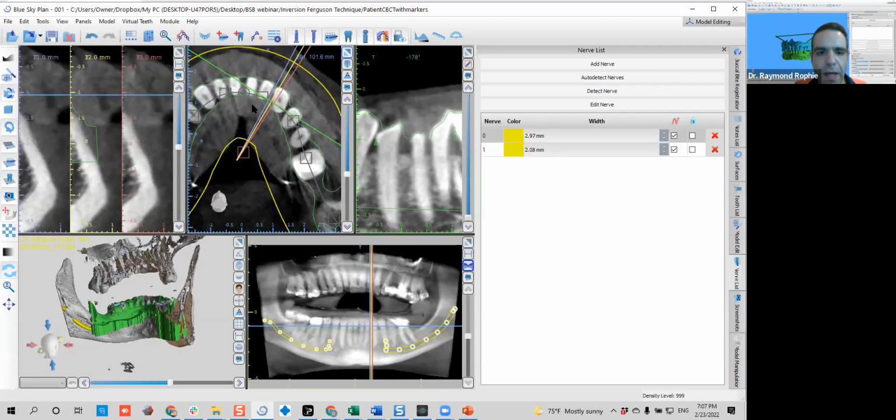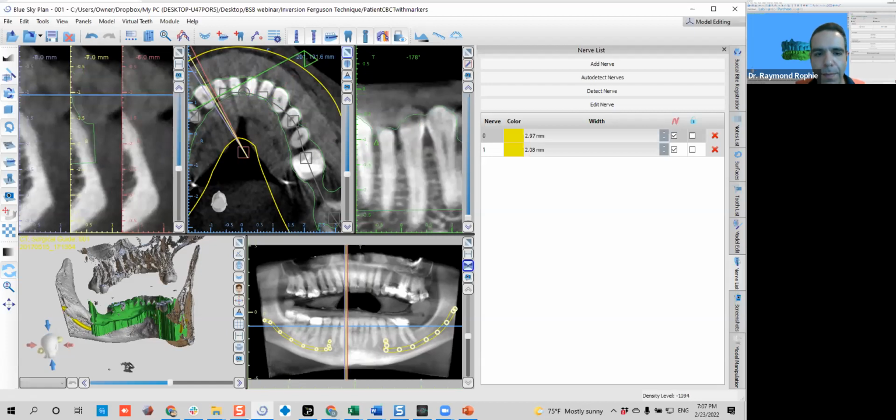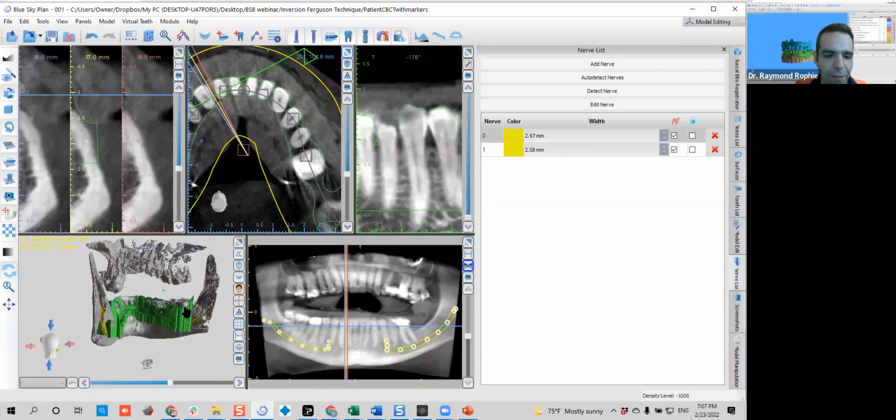Okay. Corey Glenn has one very good video about nerve mapping. If you're doing full arch cases or very complex cases or implants, like in this case, where you have very limited space to work, it will be very good to have your nerve very well mapped. Okay, good. So now we have our nerve.